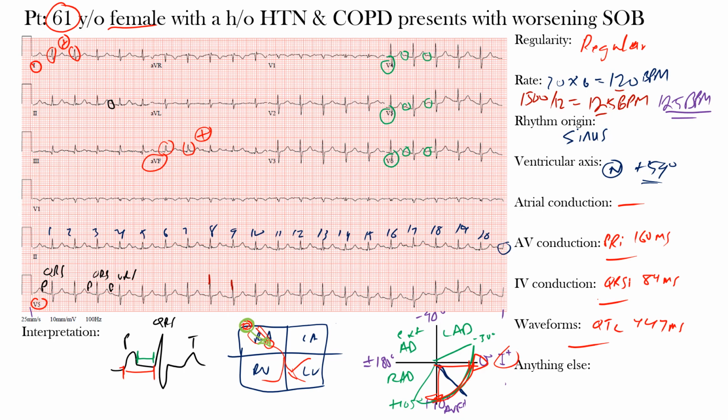And what we're talking about here with this R wave progression is you can see these small R waves that are a little difficult to see, but they are present there, okay, in V1, and then all of a sudden you see this bigger leap in the R wave amplitude, okay, but from V2 to V5 we see an increase that is progressing normally with the R wave amplitude. So in this case, maybe V1 wasn't placed properly, or there's stronger anterior forces that this would suggest.